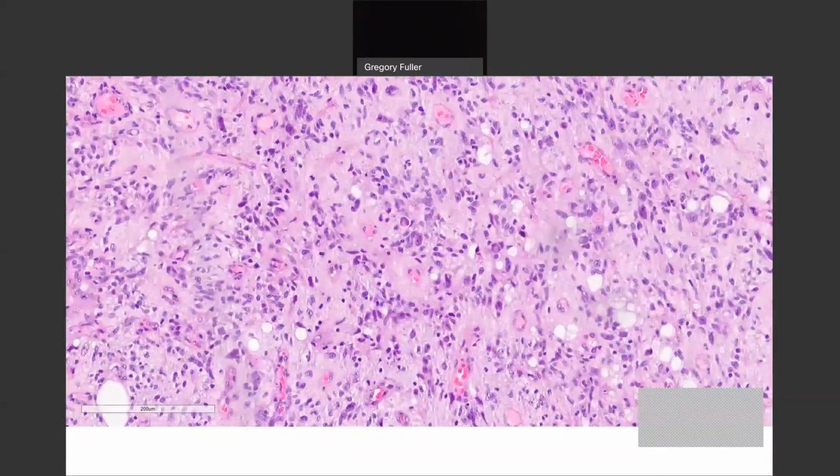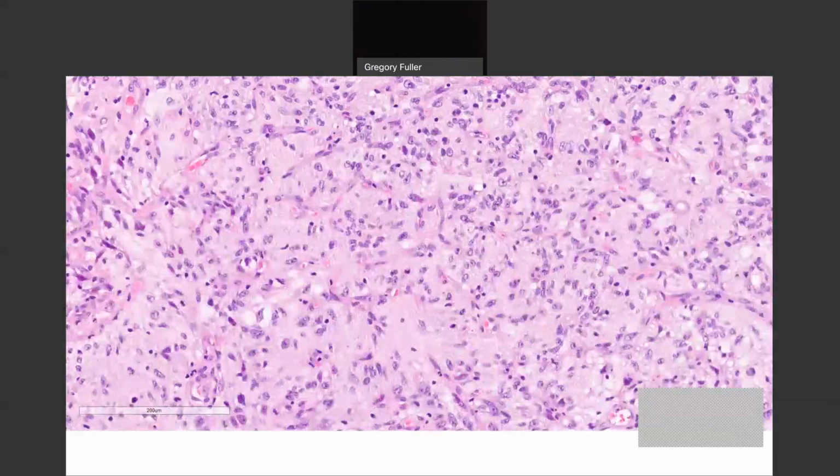Now, this is where it got interesting. You're thinking, what in the world is going on? There are multiple perivascular pseudorosettes, poorly formed, if you will. The cells are kind of irregular, not so oligoid, more astrocytic-like, but that's an interesting pattern. All right, and now here, that is what's so-called endocrinoid or chicken wire vasculature. That's what you're seeing in the area all around here. If you see my cursor, all of this stuff down here is chicken wire, endocrinoid vasculature.